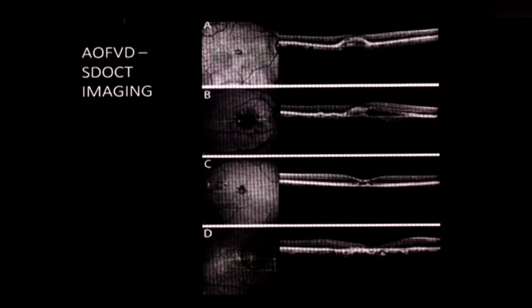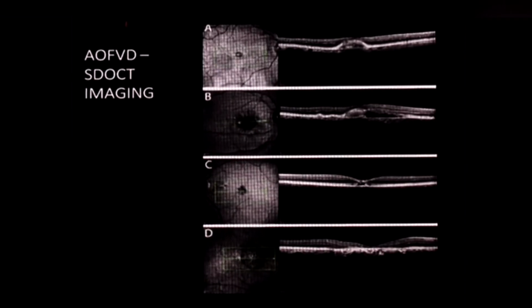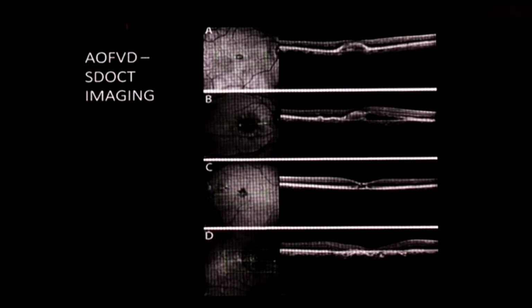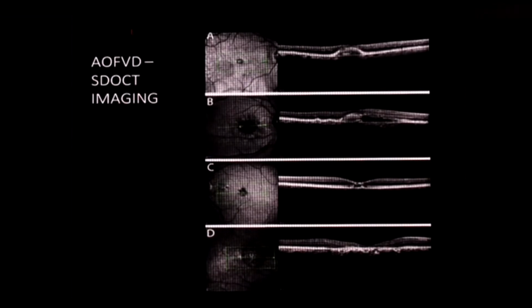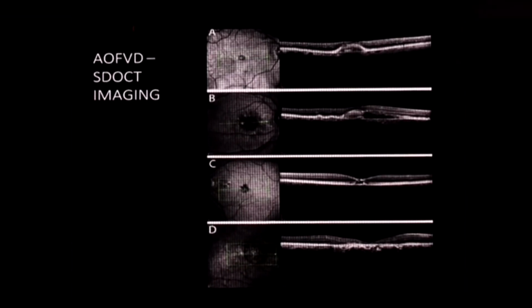Of course, the classical description is for SD-OCT, and the initial stage is that of a dome-shaped lesion. This dome-shaped lesion contains a uniform hyperreflective material which separates the RPE from the photoreceptor layers. This subsequently goes on to break down, and you would see areas of hyporeflectivity. And then as the photoreceptors as well as the RPE atrophy, you would see a collapse of the lesion.